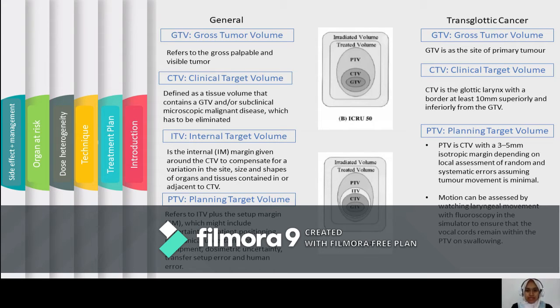PTV refers to ITV plus the setup margin, which might include uncertainty of patient positioning, mechanical uncertainty of equipment, dosimetry uncertainty, and transfer setup error and human error. However, separate delineation of the ITV is not necessary, but motion should be included in the PTV.